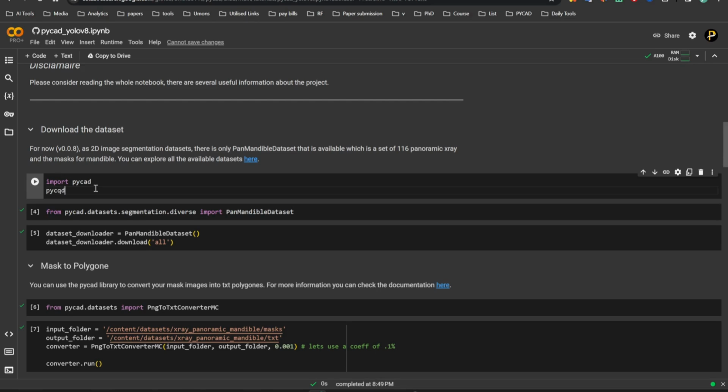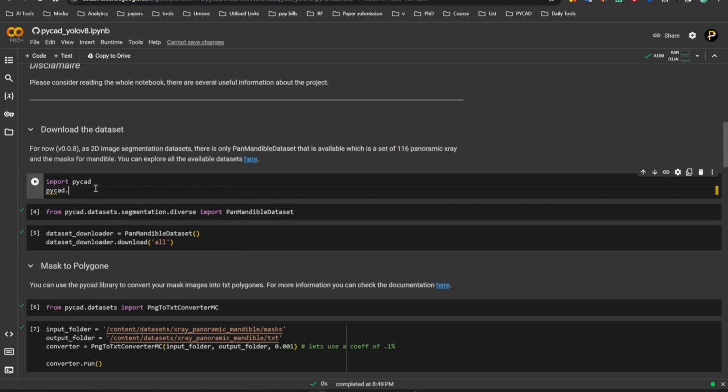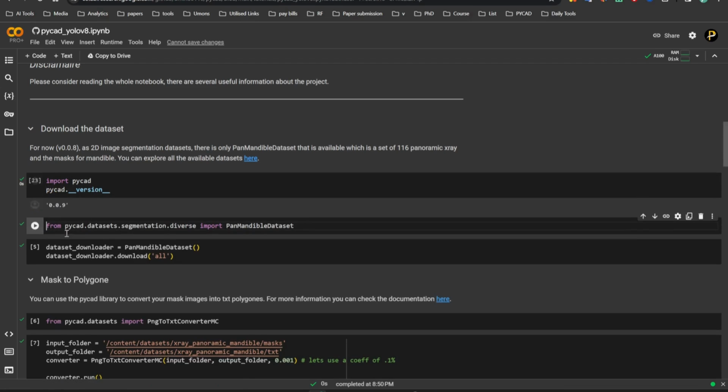Okay, so we have pycad.__version__. Let me run this to check the version. So it is 0.0.9, which is the latest one. I don't know when you will see this video, but you should at least have 0.0.9 or greater, because with less than that, you will have some issues.